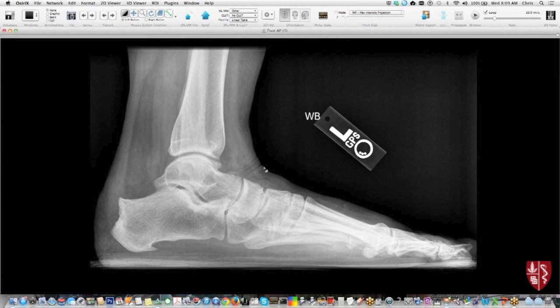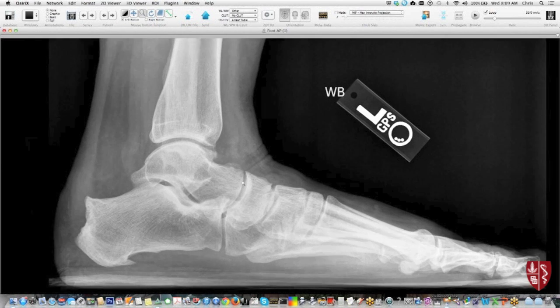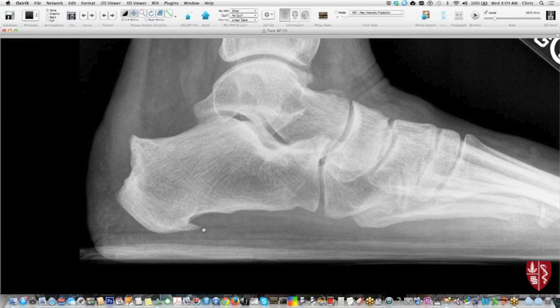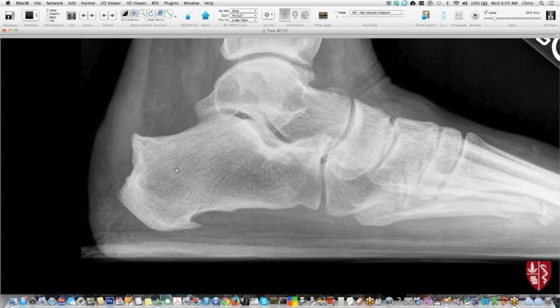One other thing on the inflammatory side of things: we see a lot of feet, and we love them, and a lot of these plantar enthesophytes, so plantar calcaneal enthesophyte. In this patient, they also have a prominence of the calcaneal tuberosity. It's rather sharp in here. And the arthritis that goes hand in hand with psoriasis, if you will, it's pretty similar, is now called reactive arthritis. It used to be called Reiter syndrome, but it's no longer called that.